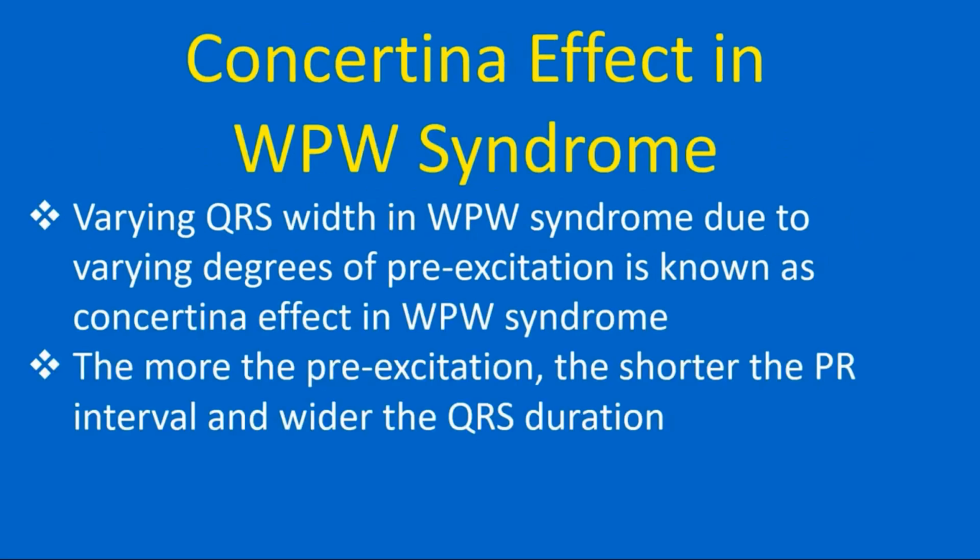Varying QRS width in WPW syndrome due to varying degrees of pre-excitation is known as concertina effect in WPW syndrome. The more the pre-excitation, the shorter the PR interval and wider the QRS duration.